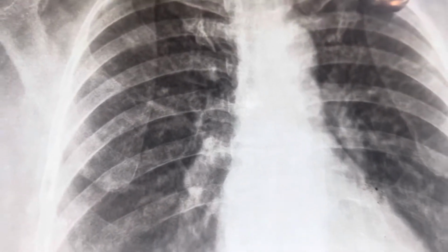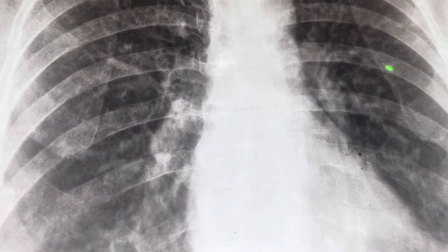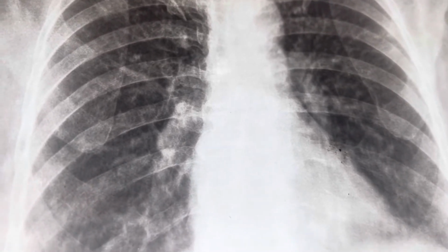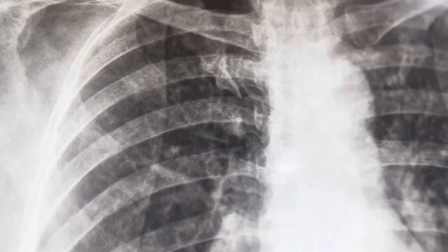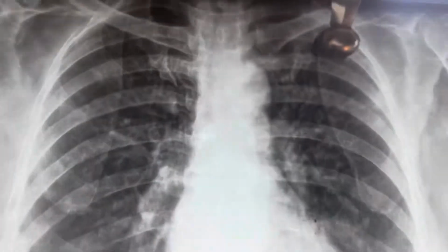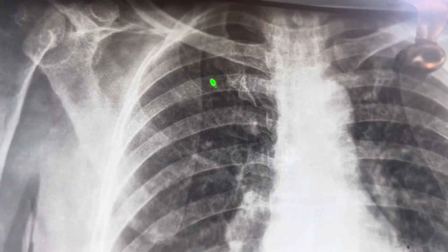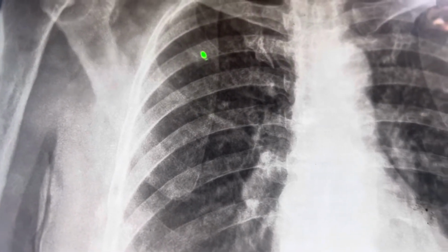So all the black colored area is radiolucent, and this whitish area, we can see the shadow of the rib. This is whitish as compared to that black colored area. This is radiopaque. There are some more radiopaque structures, but it depends on the density of the air and water in these areas. According to that we can see some light whitish or dark whitish. In this x-ray, we can see the shadow of the ribs, and in between the ribs there are the lungs, the grey colored part.